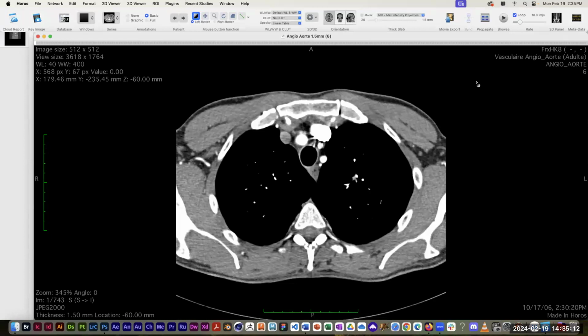There are 3 different techniques for creating a segmentation in Horos. They all involve creating something called a region of interest, or a group of regions of interest, ROIs, or some people just call them ROIs. And the region of interest is basically the structure that you're tracing. And you're going to trace it on all of the cross-sectional slices. And then, like I say, you'll then select the inside of all of those ROIs, turn the pixels white, select the outside of the ROIs, turn the pixels black, and then you can reconstruct it as a surface model.